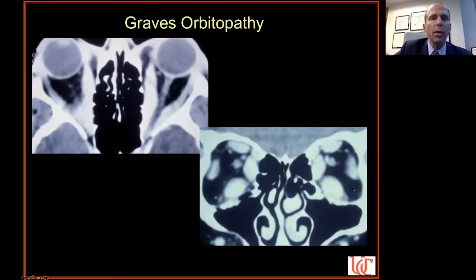Here's a patient, of course, with the orbits. We like to really look at the muscles. You need a coronal image. So this is another CAT scan. You see the bone, and you see the big muscles. For reasons that are unclear to me, inferior is most common, medial second, superior and lateral. A good example of symmetric looking thyroid eye disease with some of the extraocular muscles enlarged. So a type of inflammatory condition.